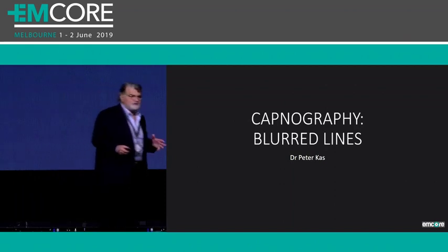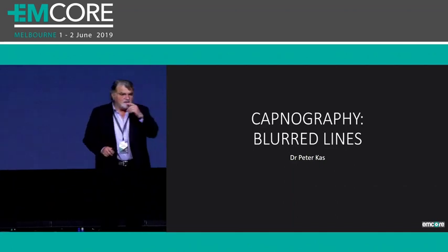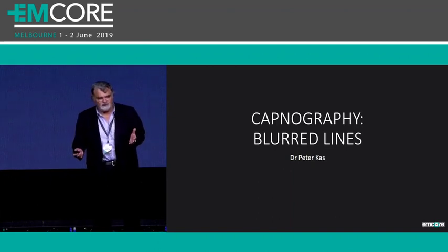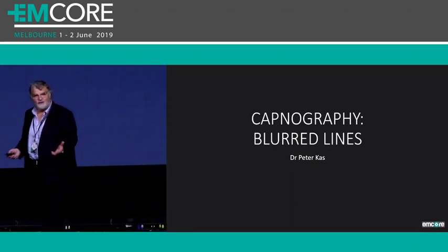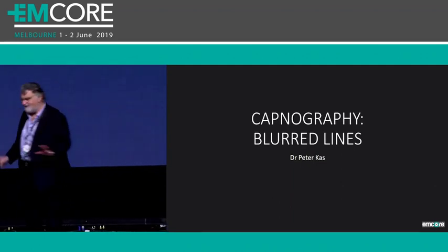And with my registrar, sometimes I'll have a look at a capnograph tracing and I'll say, wow, this patient's liver function test might be a little bit off based on that trace. And they'll look at me very strangely. And I'll just walk away like it's normal. Of course, you can't tell what the LFTs are, but you've seen them beforehand. They look it up and they go, wow, he's right. And you just never tell them the truth. Okay, you just keep going.